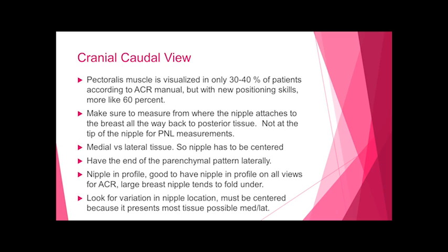Make sure to measure from where the nipple attaches to the breast all the way back to the posterior tissue on the image, and not at the tip of the nipple, for PNL measurements. It has to be where the nipple attaches to the breast.